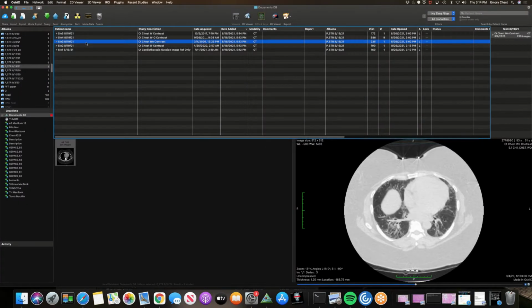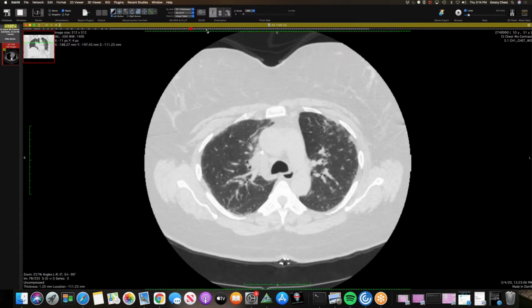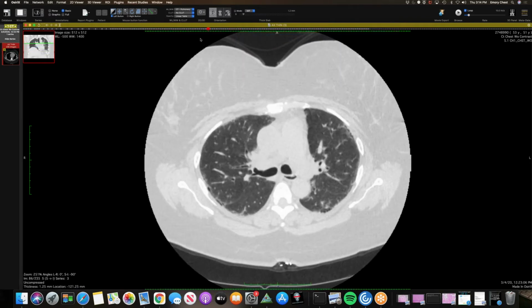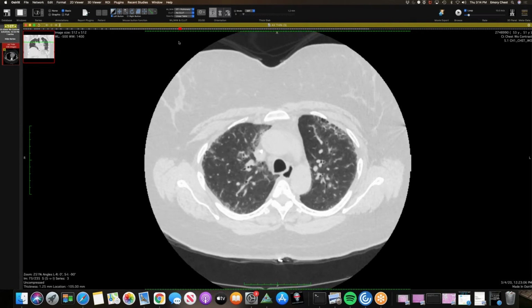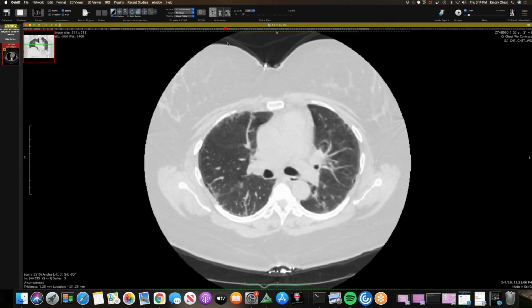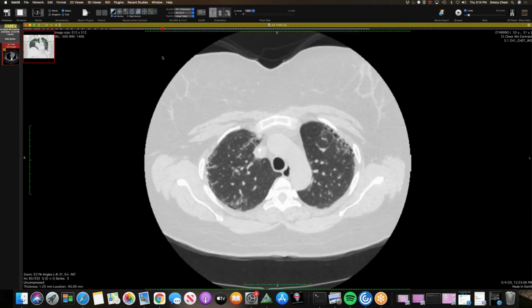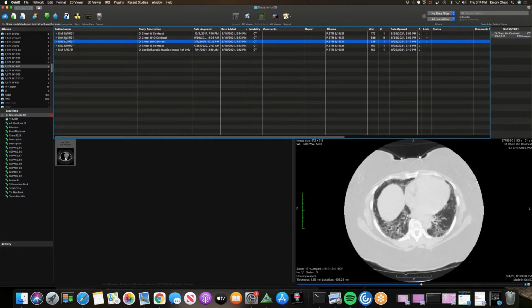And then this is a more advanced example again. Is this pure lupus, or is this lupus combined with some other? These were SLE cases, lupus. Not combos. No. Yeah, that's kind of what I was wondering, David. This was some overlap. So we've done them before.